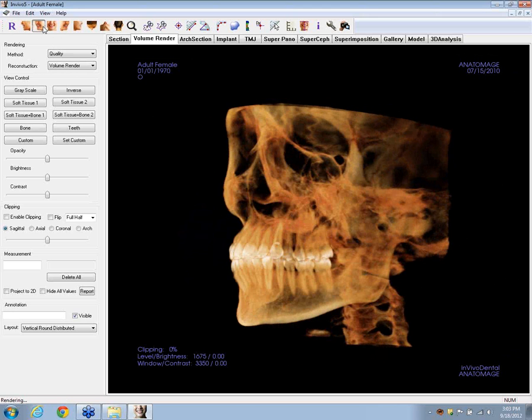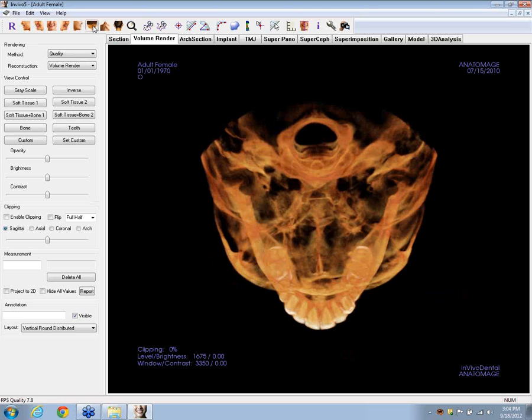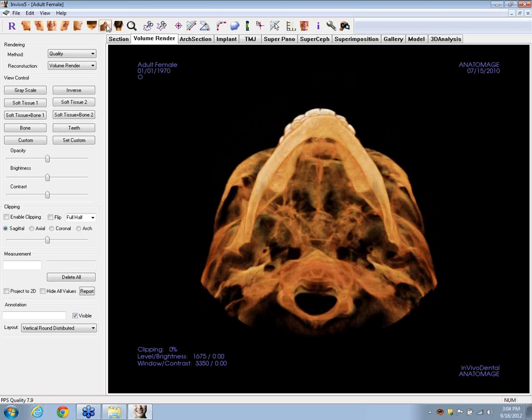Okay, so we can set up what is perfectly straight across. This can help you in orienting this image for the task that you're getting ready to do, what you're getting ready to view. We can align, again, a misaligned patient so that they're perfectly straight, perfectly oriented the way that you expect them to be as you look on screen here.